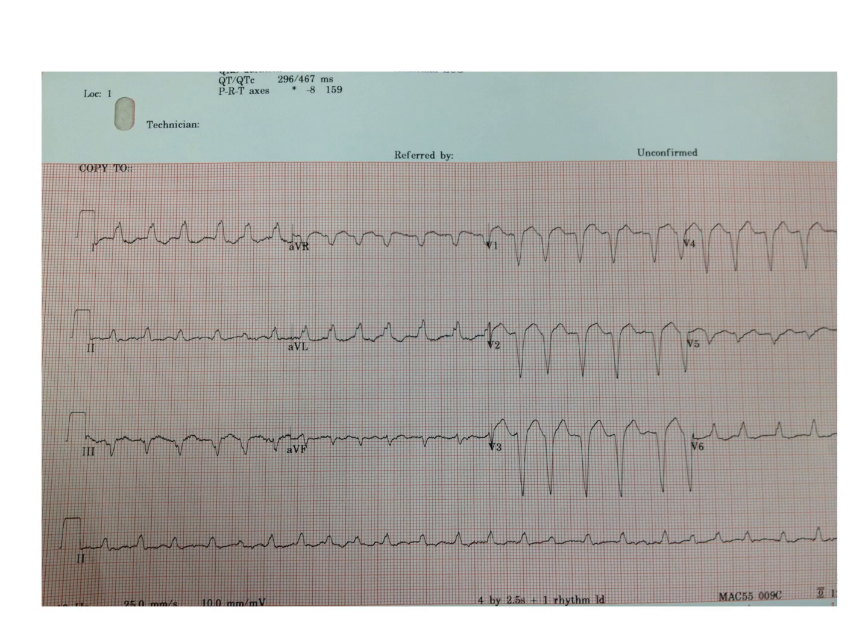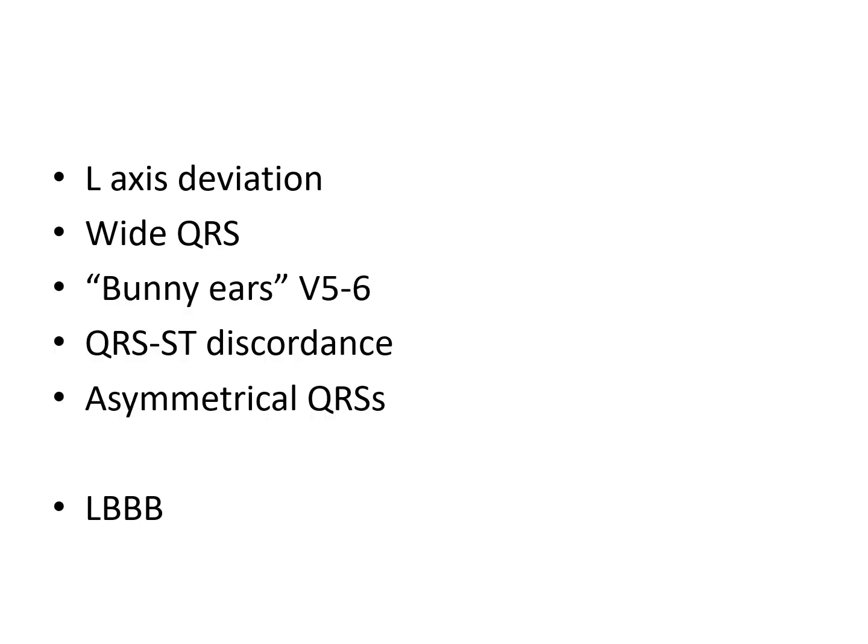And it's so left dominant, and it's left dominant in the precordials because leads V1, 2, and 3 are strongly negative. V6 is wholly positive. And then we have QRS widening, the RSR prime mostly visible in 1 and aVL, the QRS to ST discordance, when they're pointing in opposite directions relative to each other, and we have those somewhat asymmetrical waves in the precordial leads coming almost straight down, coming back at an angle. So this is a left bundle branch, and again, these are the reasons why.